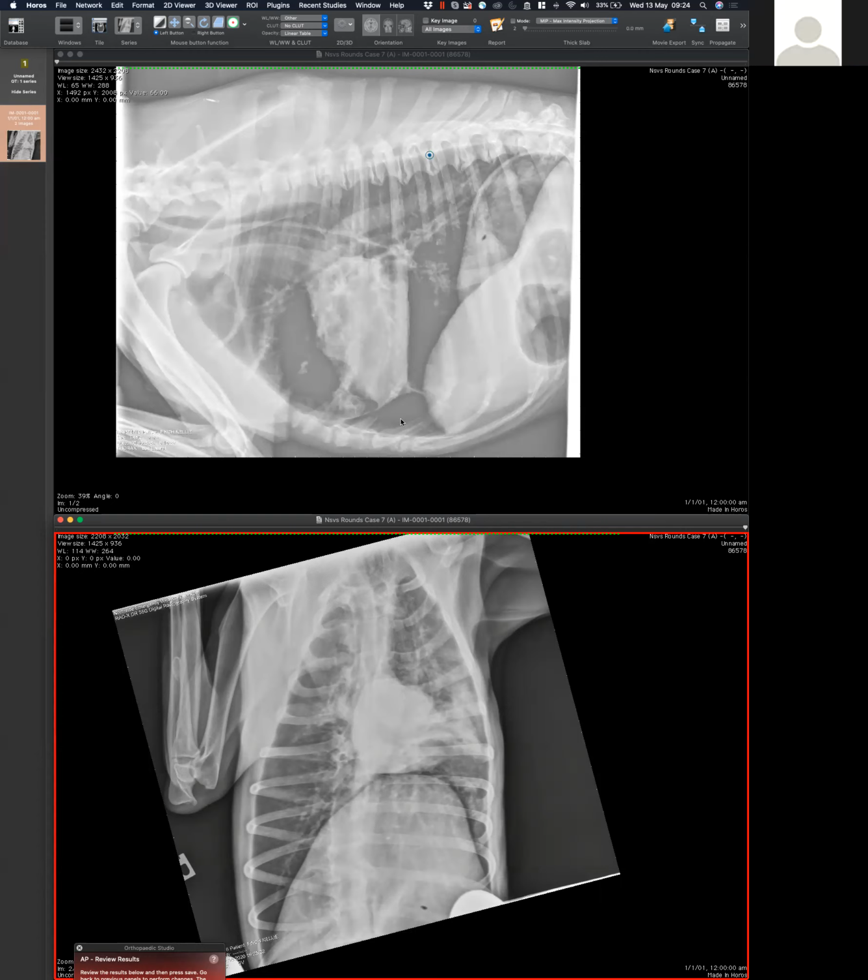And now we come back to why is it that we have elevation of the heart with pneumothorax? Basically it's because the lung gets smaller. And the exception to the rule that I always try to mention anytime I teach or talk about the separation of the heart from the sternum is that there is one very big exception. It's a very thin dog with a deep chested conformation. In those dogs, the lungs can go around the heart and make that impression of elevation of the heart.